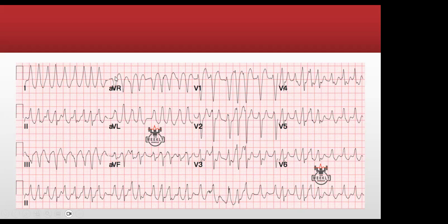No, they appear to be negative. So the axis generally, I think there's an inferior axis. But sorry, looking at the rhythm strip down there, it's irregular. Brilliant. So I think it's more of a maybe pre-excited AF or something.